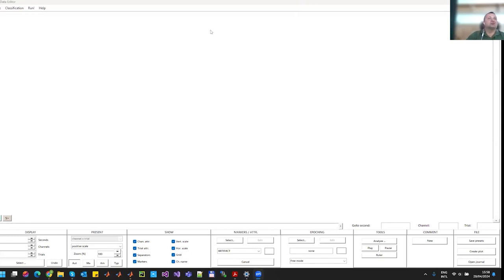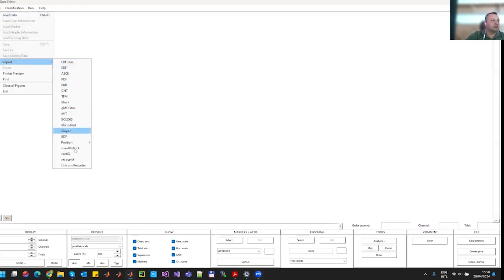So today I will go step by step in presenting you how to do the offline analysis for recoveriX datasets. Okay, so on my screen, I haven't created slides, but I will do an online and step-by-step demonstration. The first step in here on the screen, we see the g.BSanalyze software. And the first step would be to load the recoveriX dataset.